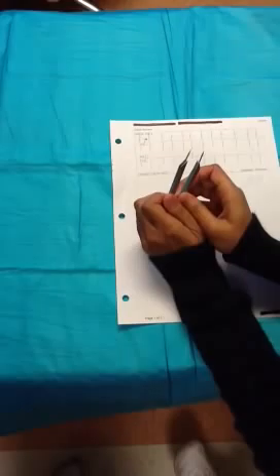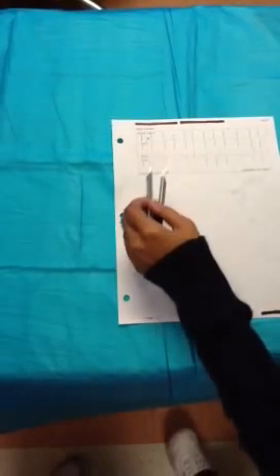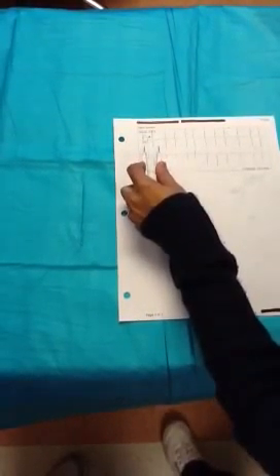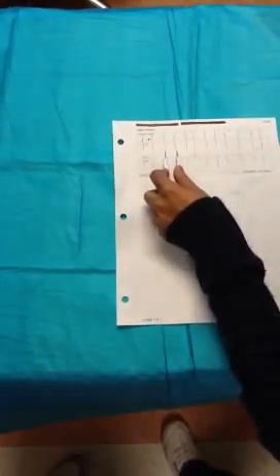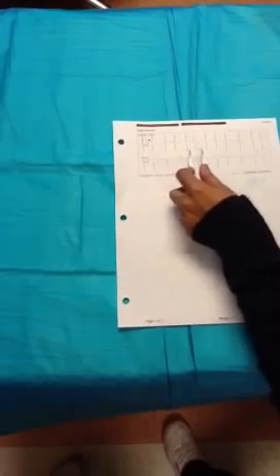So today we're going to learn how to read your strips and determine whether it's AFib. First thing you do is see if it's regular or irregular. You can tell that by looking at the distance between the R to R and whether they're equally spaced. As you see, the R to R is not equally spaced.